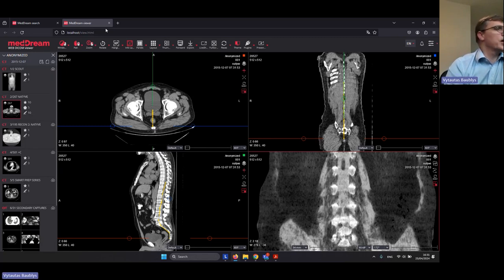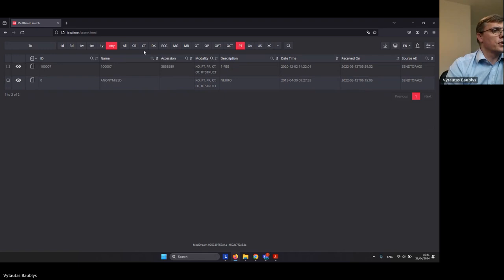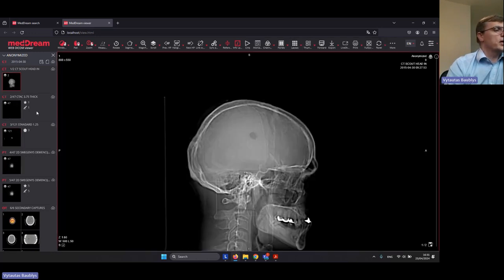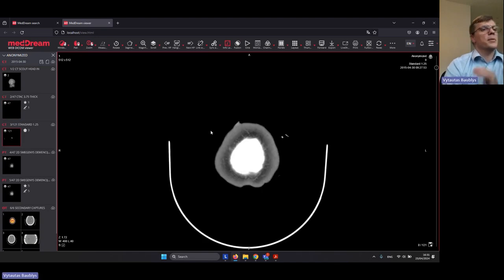So let's switch now to another topic which I presented in my presentation. I believe now we will switch to advanced PET. Let's select some PET image. So yes, for example, I have a PET image. Let's shrink to 1. Yeah, this is my PET image.